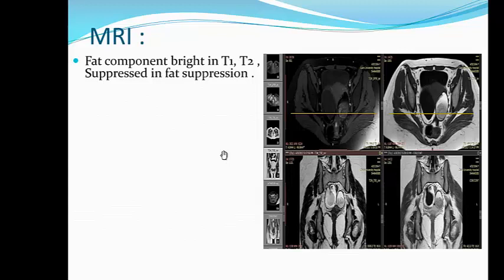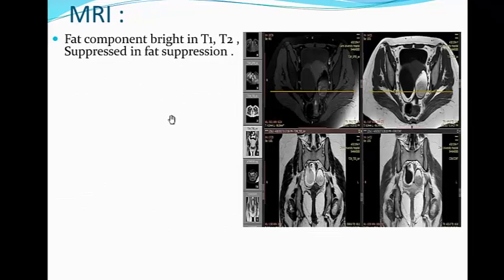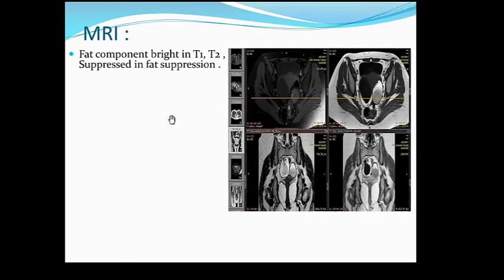And please, when you write in the conclusion, don't write likely. The MRI is diagnostic in these cases, so don't write likely. It is ovarian and it is mature cystic teratoma, so don't write likely. Fat component bright in T1 and T2, suppressed on fat suppression.